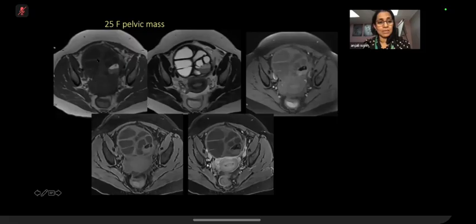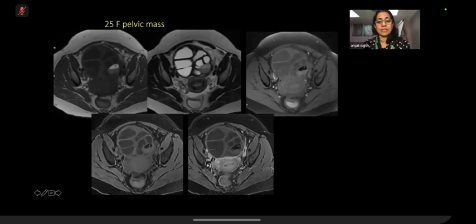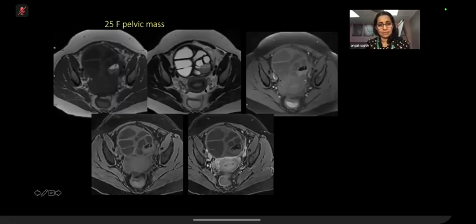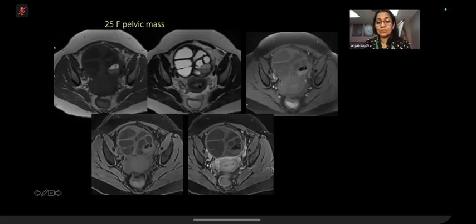So what am I pointing at? I believe that is T1. T1 axial, good. And what is this? That is T2. How did you say this is T2? I think there's high signal. Oh, sorry, that's low. There's low signal in the uterine cavity, I think. There is a bright signal of endometrium, and you can see bright signals of ovarian follicles.